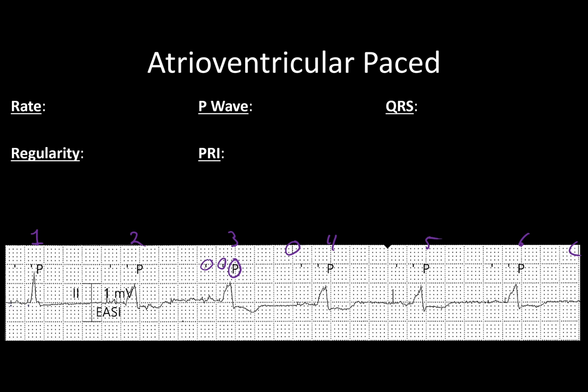But for beat number 4, they're just barely perceptible. On a monitor, they should show up as a different color to give them contrast so that they stand out better, but when you print them out in black and white like this, those little hash marks are what give you an indication of where you need to be looking on the waveform strip to see if the pacemaker was doing what it was supposed to do.